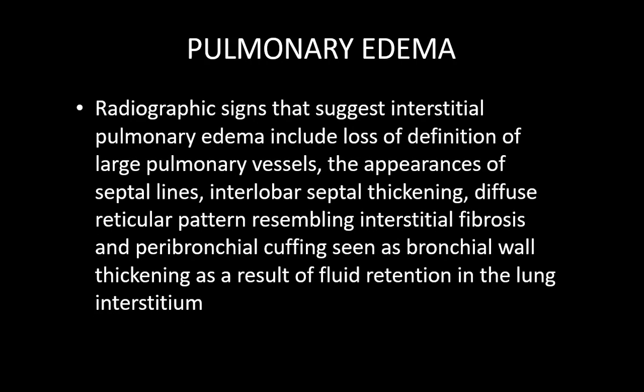Pulmonary edema, to start with, is interstitial pulmonary edema, where you see there is loss of definition of large pulmonary vessels, there is appearance of septal lines, interlobular septal thickening, a diffuse reticular pattern, and peribronchial cuffing. These are all the findings when there is interstitial pulmonary edema.